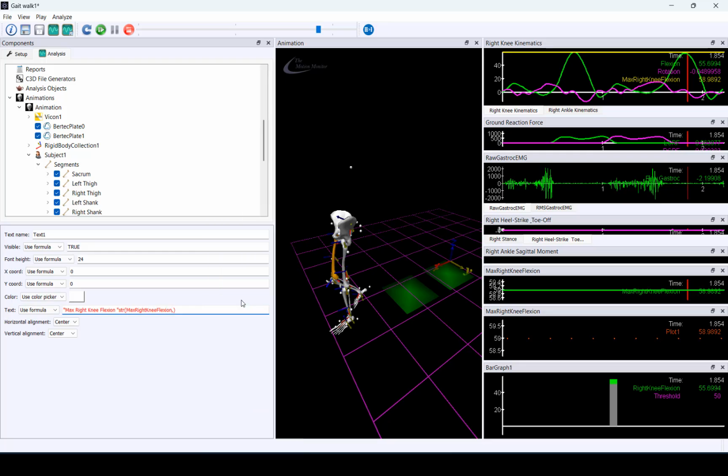We will choose to display 3 decimal places in this example. To concatenate this variable and the surrounding text, we will add in a plus sign before and after. Lastly, we can add in our units inside quotation marks.